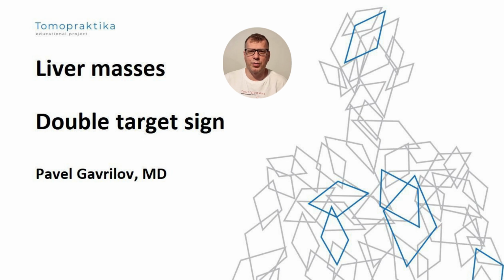Today, I'd like to talk about one of the more specific CT findings when evaluating liver lesions, the so-called double target sign.